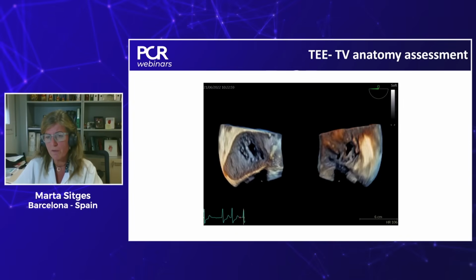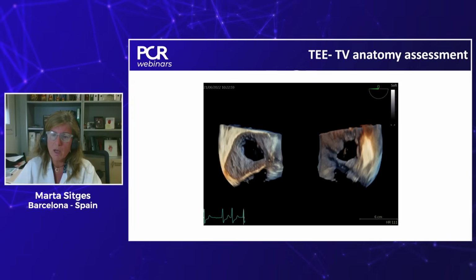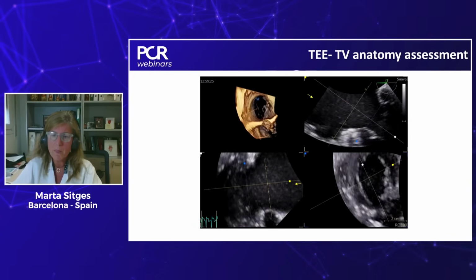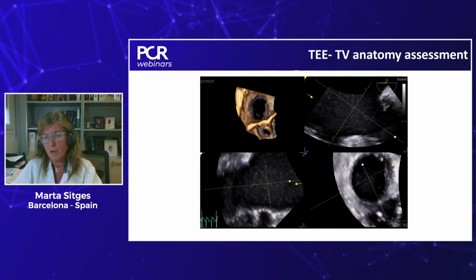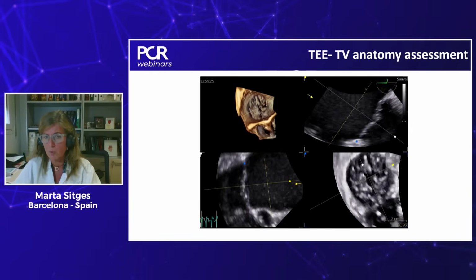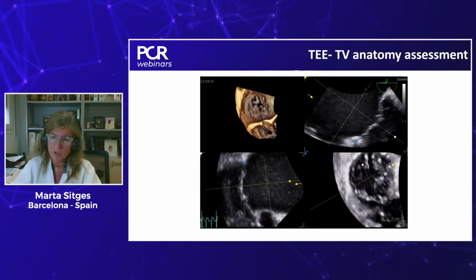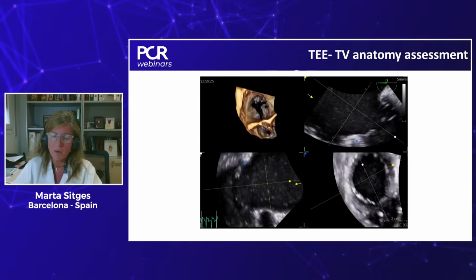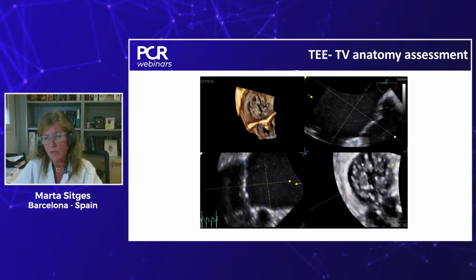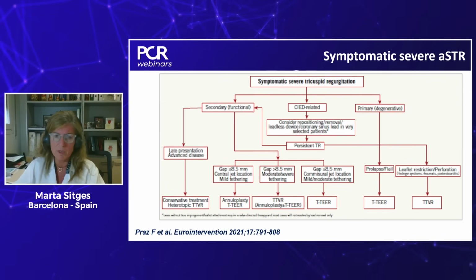We also now have the visualization from the atria and the ventricle at the same time, which is particularly interesting during the procedure. And finally, if we have difficulties with all these other things, I also think it's nice to double check and reconfirm with MPR reconstructions, which are already available online, and that we can also use during the transcatheter procedure.